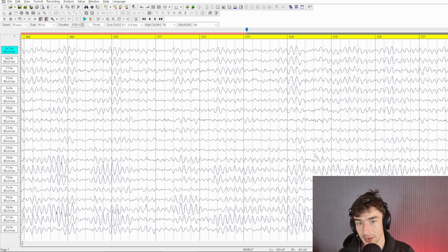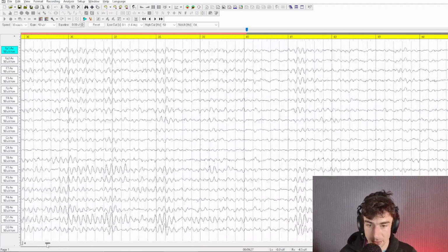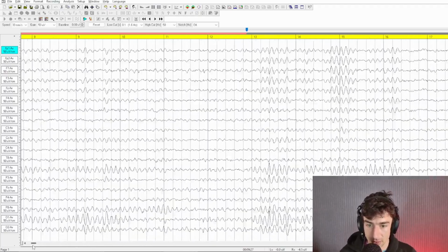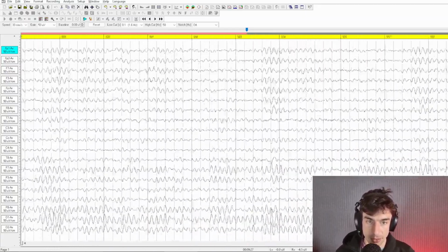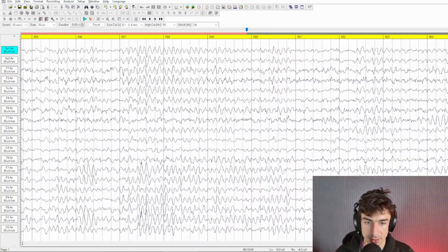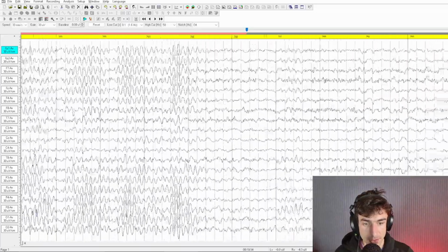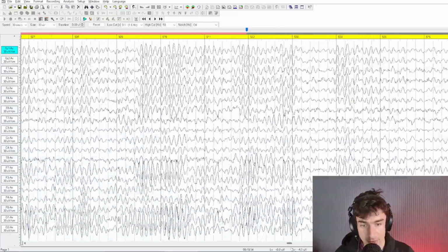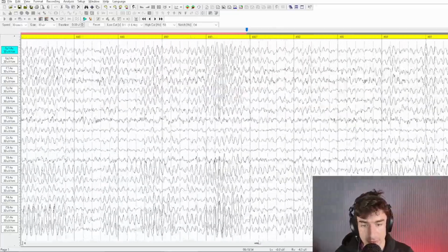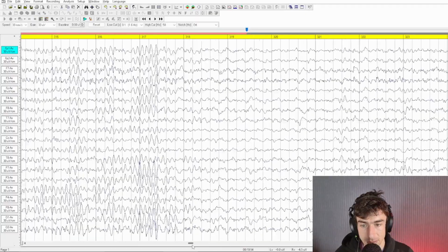So we're just going to take it as it is and identify the main features that we've already seen and grab some screenshots of them and then pull out any zones where we really need to eliminate the EMG. And the EMG is something that we'll see in the spectra, but we can sort of just read around. So I'm not super worried about it.